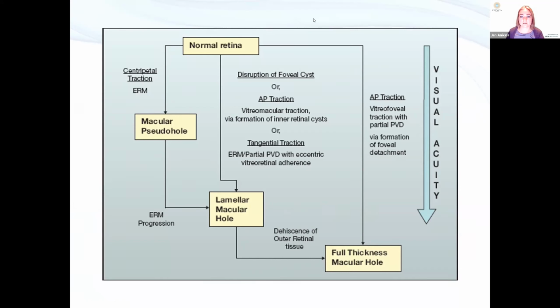I'm just going to have a quick look at the questions. Do I want all macular holes referred routinely? Yes, pretty much, unless they're traumatic. If you get a young chap who gets a football to the eye and they have a macular hole on their OCT, that one I do want to see straight away. But to be honest, I'll probably be seeing that anyway because of the other aspects of the trauma, the probable high pressure or vitreous hemorrhage or whatever else they've got in association. All other macular holes, yes, routinely.